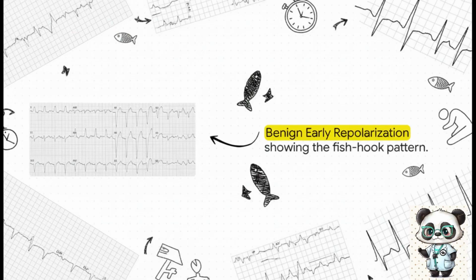Another classic mimic is benign early repolarization, or BER for short. This is just a normal, benign variant that we commonly see in young, healthy patients. It causes mild ST elevation with tall T waves, mostly sitting in the precordial leads. What's super cool here is that subtle little notch right at the J point. See how it looks like a tiny hook? That's exactly why it's perfectly nicknamed the fish hook pattern. Also, keep in mind, these ST changes might look more prominent when the patient's heart rate is slower, and they can actually completely disappear if their heart rate speeds up.